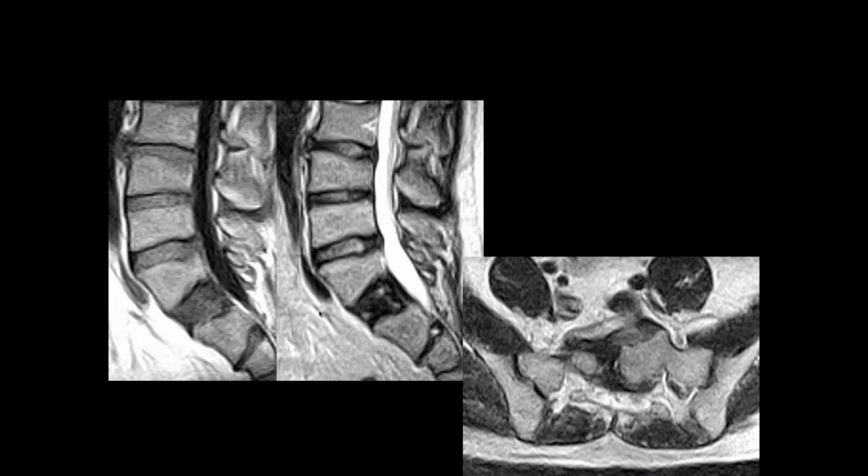Shiv, what do you think of this one? Okay, it looks like the sacrum, that's one level vertebral body. It looks abnormal to me. Yeah, it looks like possibly a butterfly. So this is the same thing here, where we have a sagittal cleft in the middle. In this case, it's S1. It's more commonly seen in the lumbar area.